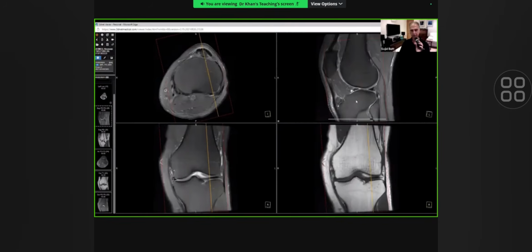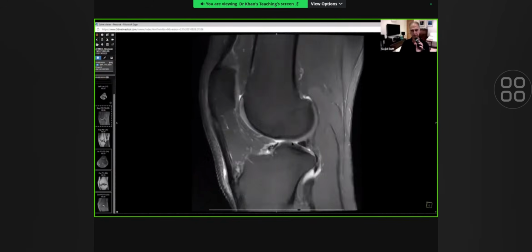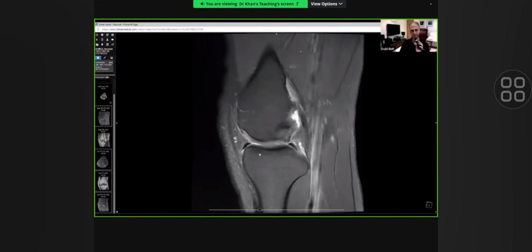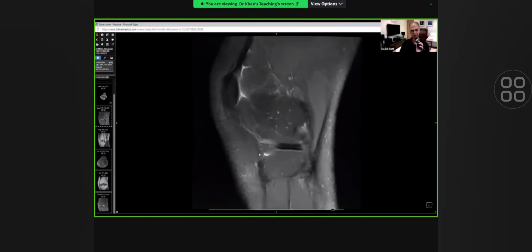Going back to the sagittal to confirm what we saw, on the medial side, we've got normal ACL, we've got normal PCL. The line drawn here touches the femur, doesn't go up and up like what we saw in the earlier case. Then we've got an intact and normal looking lateral meniscus, a normal conjoined tendon and collateral ligament.